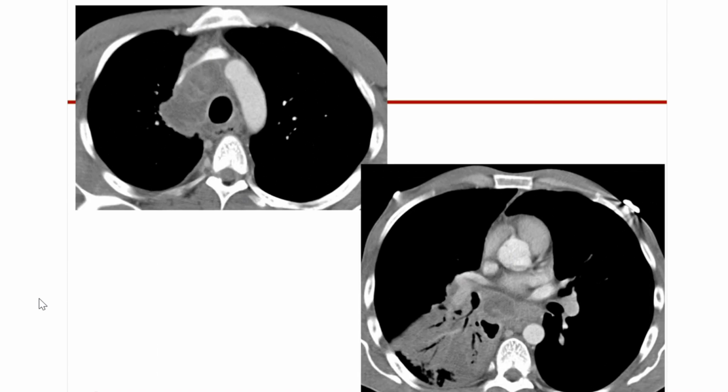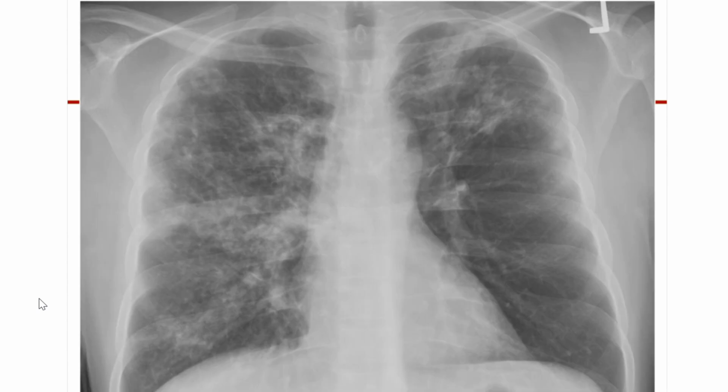So this is an AIDS patient, and you can see he has necrotic lymphadenopathy, all right? Very characteristic. We know that this kind of lymphadenopathy, fortunately in the chest, has a differential of 2 things, right? Squamous cell and tuberculosis. That's it, all right? Very easy. We don't have to get fancy, right? And they have to sort it out. Obviously, if this is primary TB, this person should have a travel history. If this is reactivation TB, this patient should be profoundly immunocompromised, all right? If this is squamous cell cancer, well, hopefully this patient has a history of smoking, and we can sort it out.